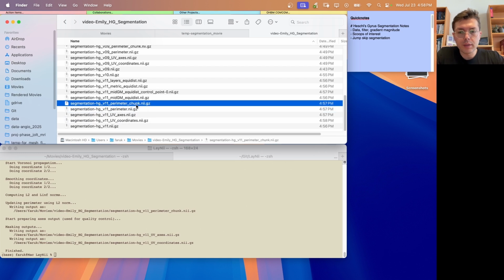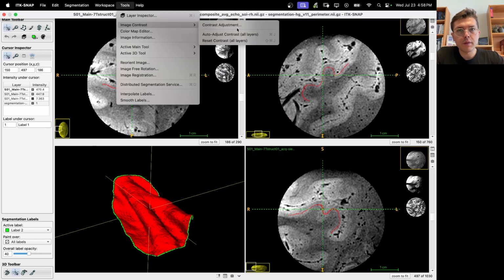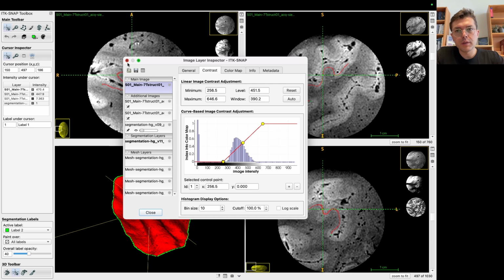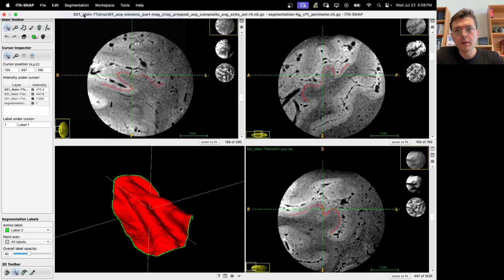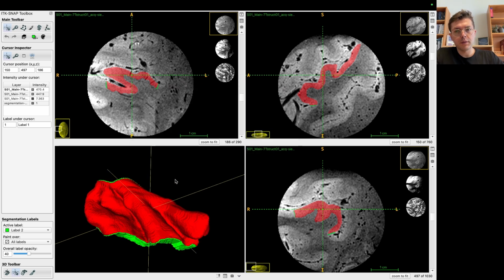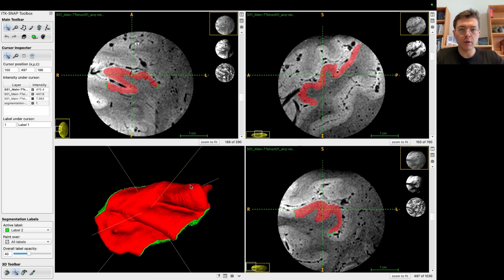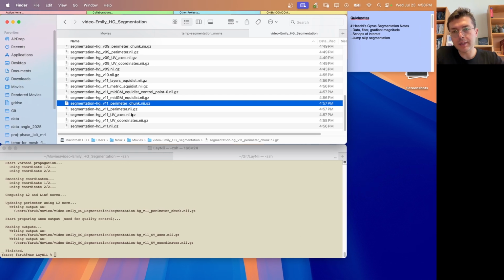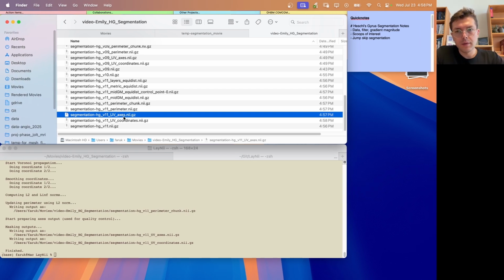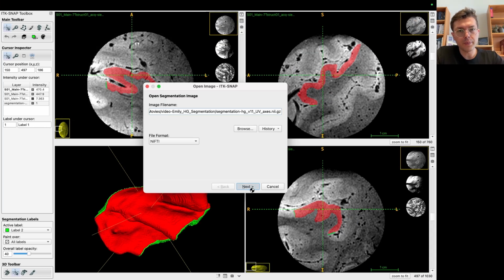Okay, now let's have a look at the other outputs. Perimeter chunk, for instance. Oops, not here. Finish. Something went wrong because it got too elongated. This can happen when you are really at the edge and not exactly there. We can see it from UV axis. These are all important quality control steps, so I'm just showing you how things are.